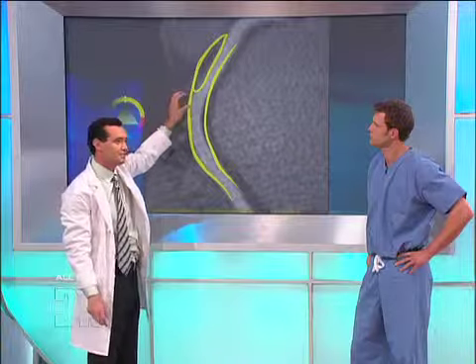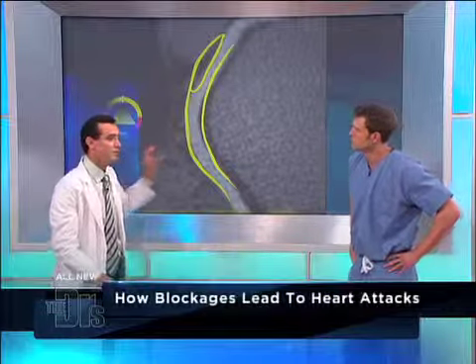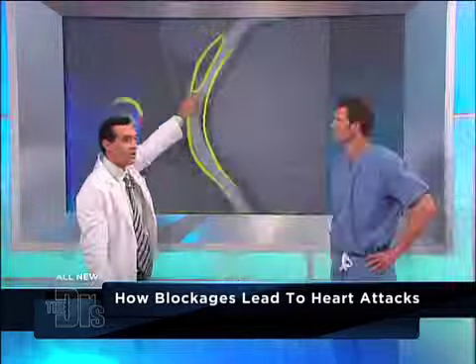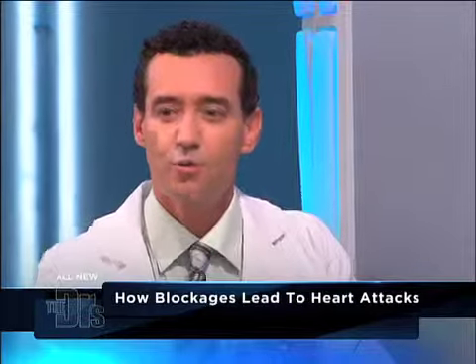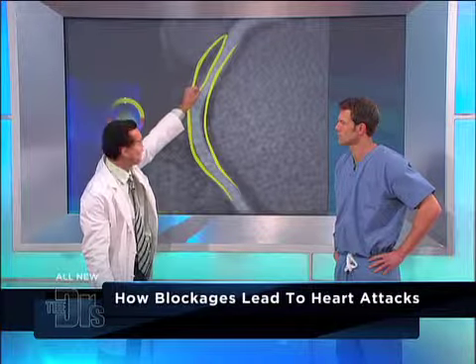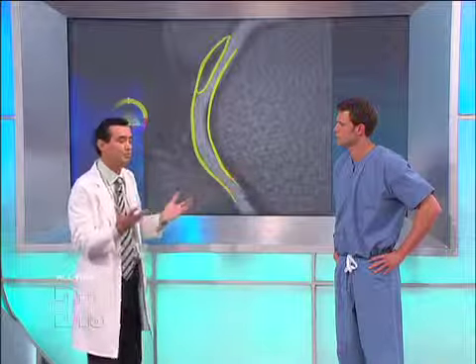And this is important to identify, because when you have this, that tells us to be very aggressive with risk factors. Lowering your cholesterol, lowering your blood pressure, treating your blood sugar, incredibly important. And one other fact I'll make is that most heart attacks are not caused by a severe narrowing. Most of them are caused by blockages just like this one. This is sort of a weakening in the blood vessel that's vulnerable to tear or rupture. And once it tears, your body clots off to try to heal itself, and that clot then blocks blood flow to the heart muscle, which is what causes a heart attack.